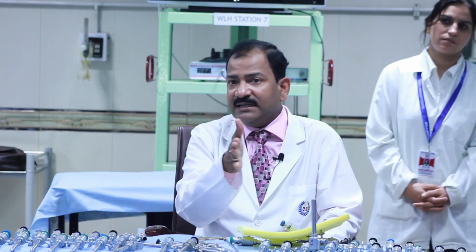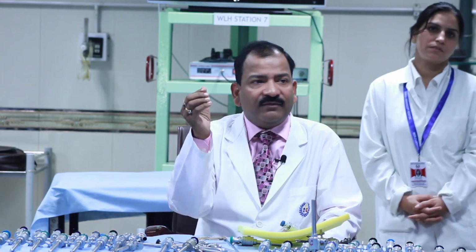And the best elevation angle in the world to perform anything is 30 degrees. That depends upon the length of your instrument. So, if normal is 36 centimeters, that is why 18 centimeters away. So, half the instrument in, half the instrument out, and your elevation angle will be 30 degrees.